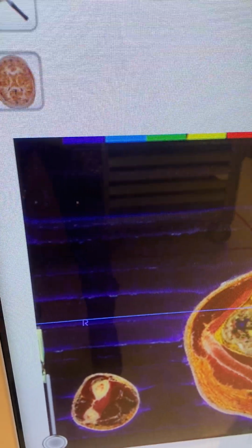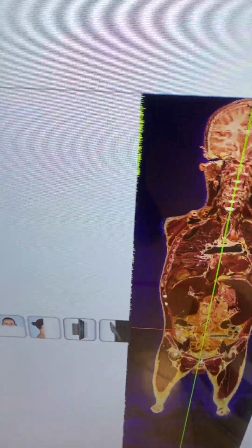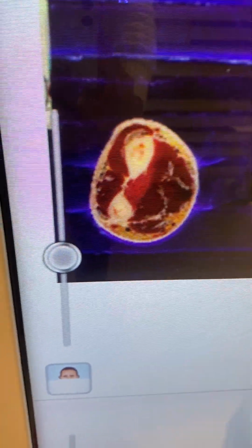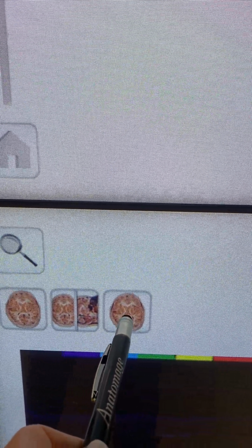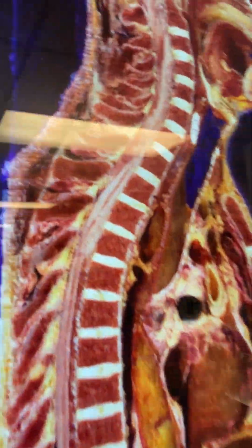There are also the icons here. These icons, by tapping, are those clipping icons. You can see different views of the image. For this one, you can just work on this view. This one has also the horizontal cut, and this one has the icon. If you want to get back to the previous one, you can just use this icon. It brings you back to the 2D again, to the one we just started.